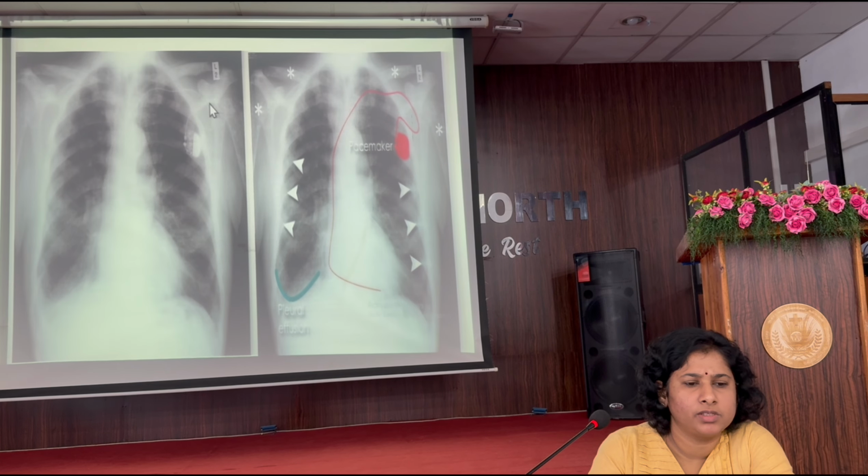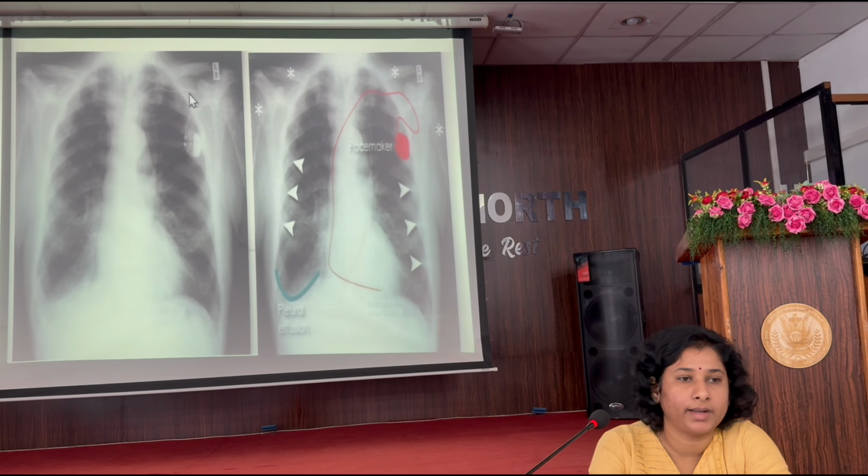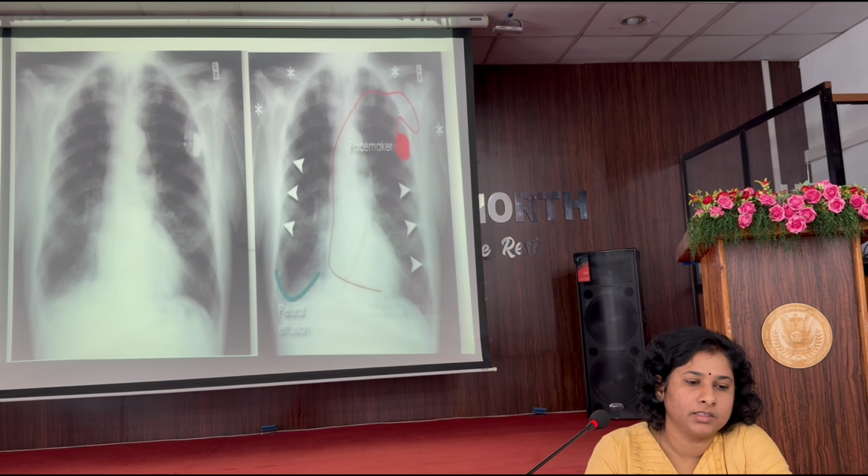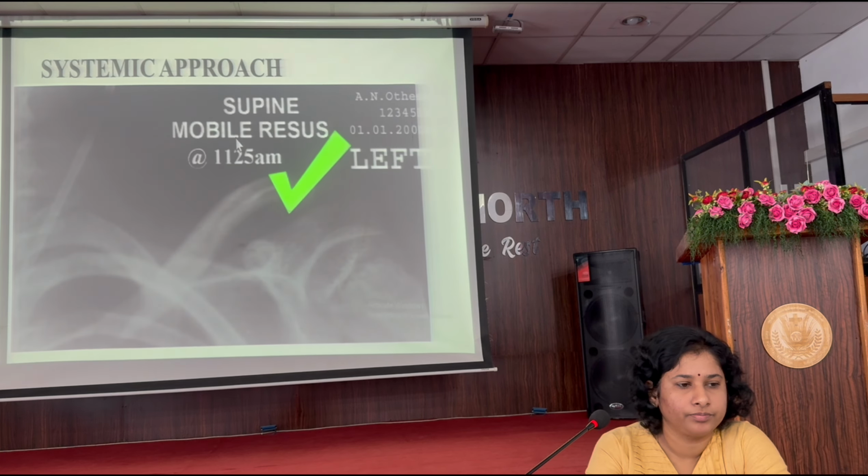In addition to that, if you see the humerus, there are a lot of metastases, right? And the clavicle is also not good. This is a prostatic CA patient who had the pacemaker, and there are bone metastases. So easy to miss. If you have search satisfaction, you can miss this bone metastasis.